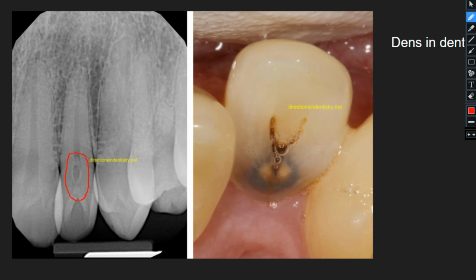you can see they've already circled here in red what the area is we're focusing on. But if you look very closely, you can see the inner layer of enamel on the additional tooth that is in that mouth. And then the darkened area right in here is the dentin. So it's literally a tooth within a tooth.